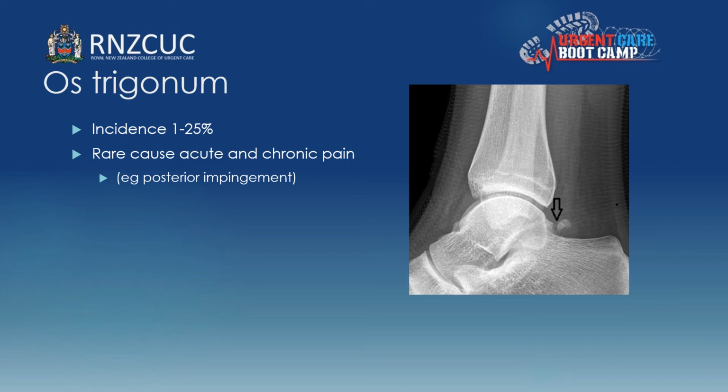Os trigonum is essentially a fibrous joint between a bit where a growth plate didn't fuse in the posterior aspect of the talus. Now, it can cause both an acute and a chronic pain. People like ballerinas who go on tiptoes a lot can get posterior impingement, and this can cause ongoing pain, but it's not a usual cause of acute pain in an ankle.